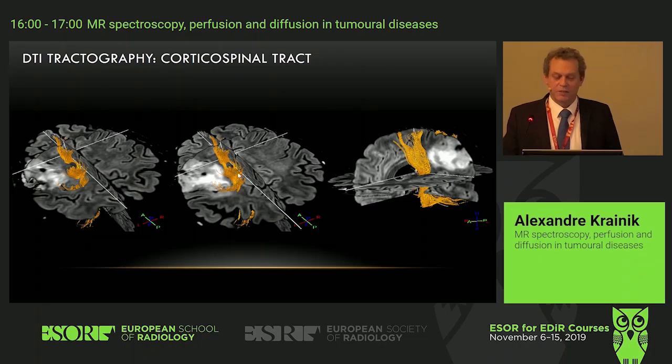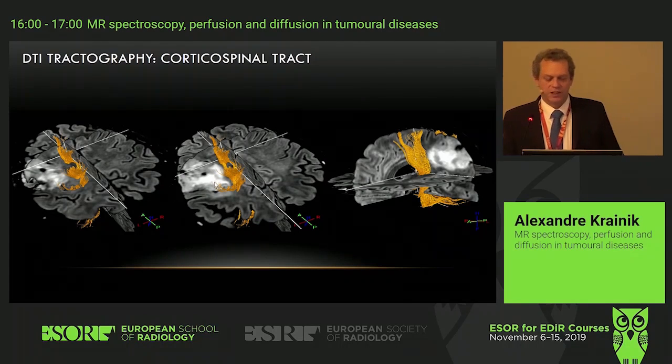Anyway, there are still some limitations, because when you have a lower anisotropy, like in a highly hyper T2 lesion, your software won't build any fibers into this hyperintense T2 lesion. Then what you see is what you expect, but you can hardly see fiber bundles into the tumor.